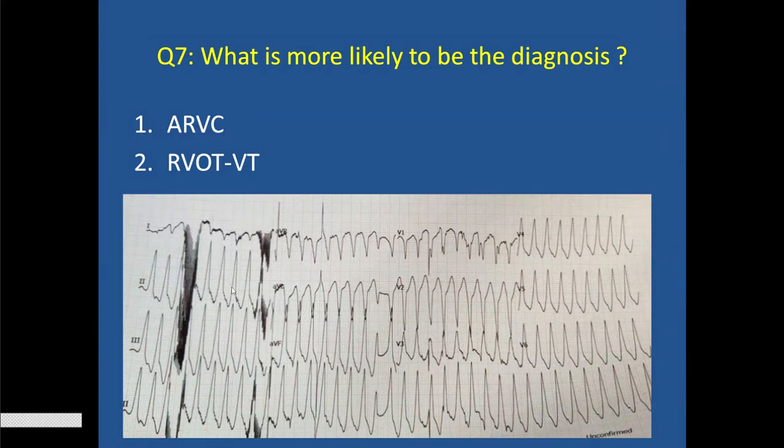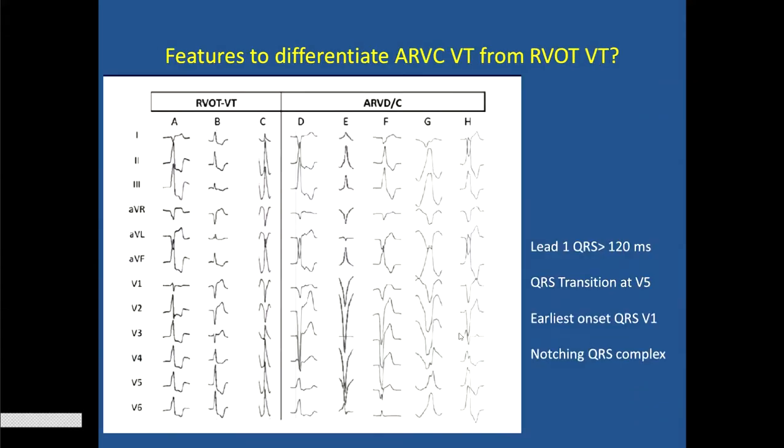So, outflow tract tachycardias are diagnosed by inferior axis, monomorphic, transition in V3 or V4. This could also be a V3 transition, could be left ventricular outflow tract as well. But only on EP study we will realize that. And this is how we manage. Such patients show the role of drugs. 1.5 months, patient is fine. If recurrence, do an ablation.